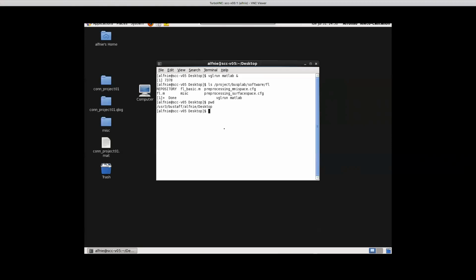Right. There is a different size of the number of vertices. So FS average has a default number of vertices that correspond to this tessellation of the sphere, and that is uniform in the sphere, while the subject level surfaces contain a variable number of vertices. So there is an interpolation needed to display that. But I think most of our display scripts should handle that interpolation automatically.